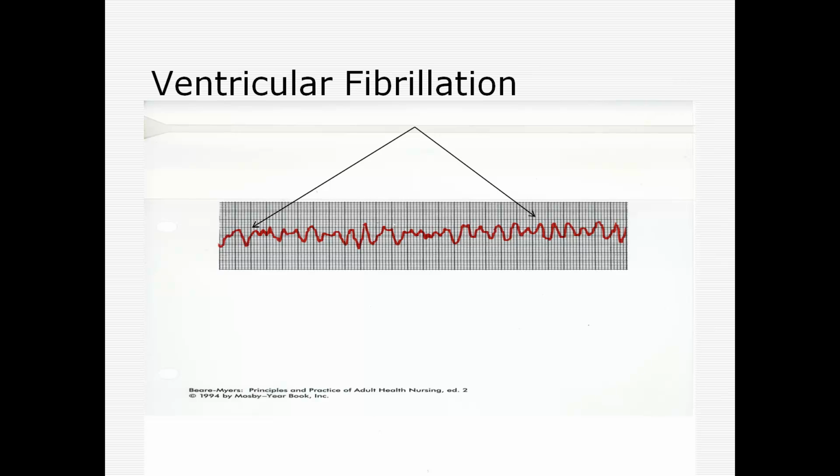heart. This is a lethal rhythm. If you do not fix this one, the patient will die. The moment this happens, they faint. I mean, there's pretty much nothing. This is what a lot of patients go into when they go into cardiac arrest. Or you hear a patient codes. This is what could be happening.